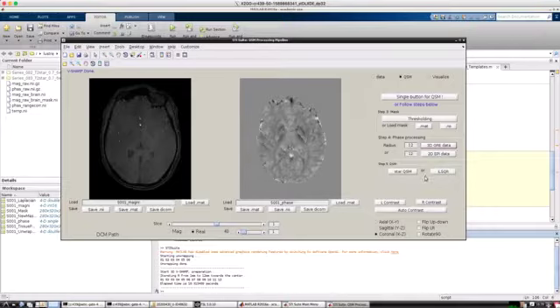So in step 5, which is the QSM or the inversion part, you have 2 alternative methods. You can either do the star QSM method or the iLSQR method. The star QSM is much faster, although I would say it's more niche and less precise. The iLSQR method does take longer, but it's more well known, and I would recommend using this one here.